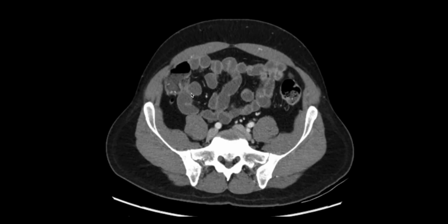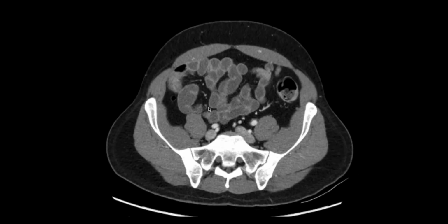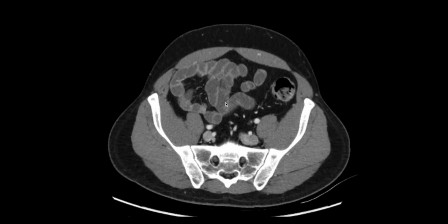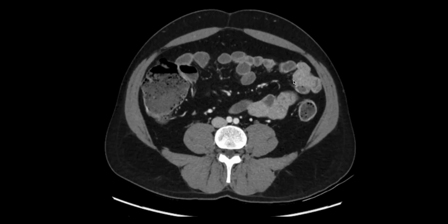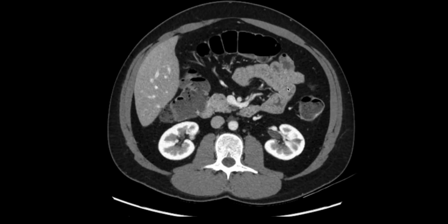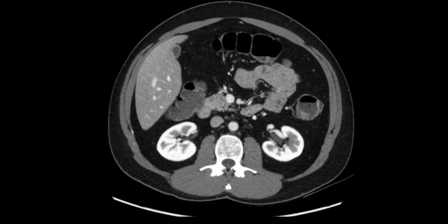You can follow the terminal and distal ileum back a little while to ensure there's no abnormal enhancement or thickening, but after that, it's most efficient to simply look at the small bowel as a quadrant, here accounting for the ileum in the right lower quadrant, the mid small bowel, and in the left upper abdomen, the jejunum with its characteristic feathery fold pattern. And we'll take a second look at the small bowel on the coronal images as well.